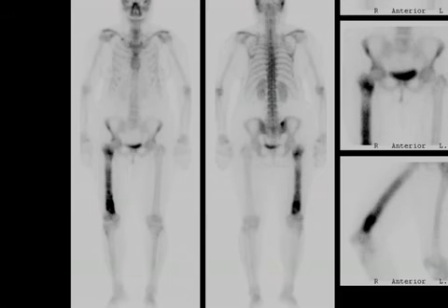A patient like this in which a large probable solitary bone neoplasm is identified is also likely to undergo a bone scan for one reason, to detect activity in the primary lesion, but also to search for skeletal metastatic disease. We can see in the frontal bone scan that there's increased activity both in the proximal femur in the region of those calcifications, but pretty extensive activity down the femoral diaphysis and particularly distally. Posterior view shows the same thing.